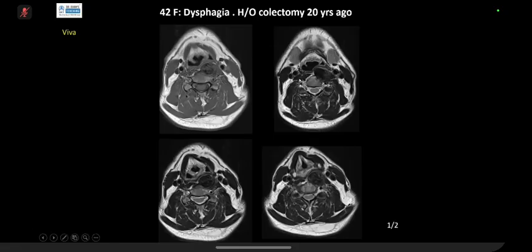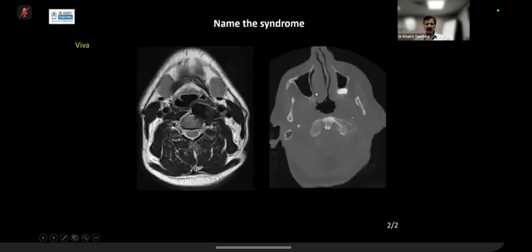If you compare this muscle, basically what has happened is that it is something within the muscle. The muscle has expanded, and there is unique signal here. It is low signal on T2 weighted sequence. You know, usually pathologies are intermediate or high signal on T2.